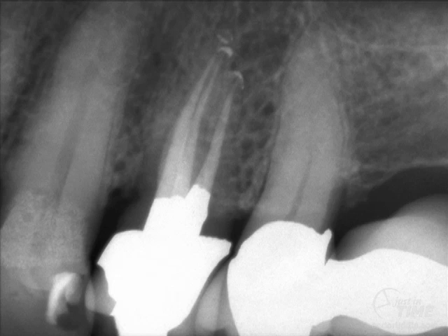And you were surprised because oftentimes the colleagues tell me they initiated treatment with a single preoperative film. I really want to stress and emphasize the importance of moving the X-ray cone up to 30 degrees off axis in the horizontal plane. So you get the straight on view, then move the cone 20, 25, or up to 30 degrees mesial to the straight on view, then go back to the straight on view and move the cone up to 30 degrees distal horizontally from that straight on view, and you will begin to appreciate before you ever talk to your patient about the anatomy.